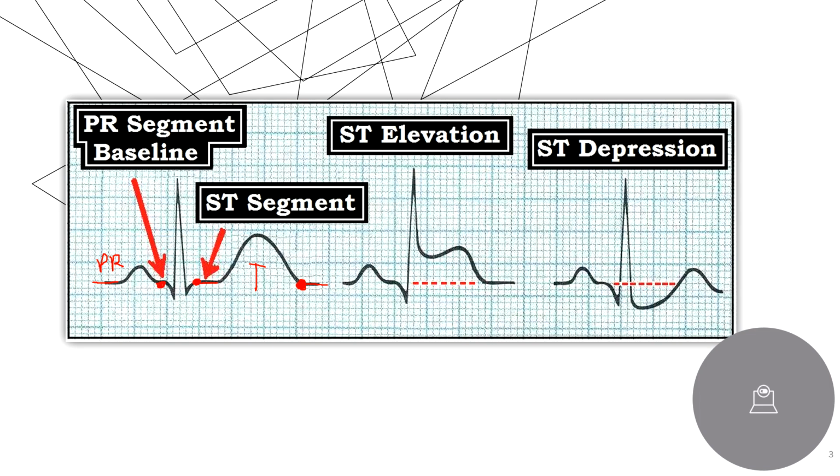If this is baseline, then you go to the front side of your T wave, right? Look at this guy right here, because this is your ST segment, this line. Is this line above it or below it? So if, for example, look at the ST segment elevation. Go to the back of the T wave right here. Okay, that's baseline. Now go to the front. Where does the QRS terminate into the T? Well, let's say it terminates right here. Now simply draw a line, and you can go, look at that. It is clearly elevated.